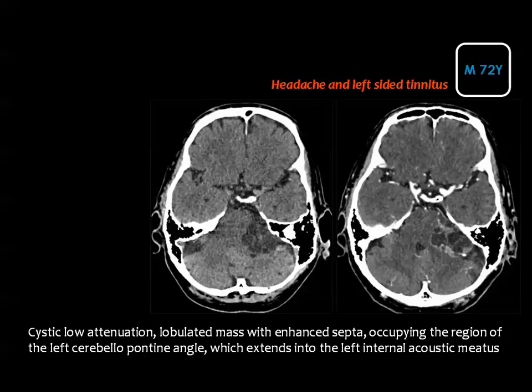Epidermoid cysts do not enhance. No. The most common cerebellopontine angle lesion by far is acoustic neuroma. 94% of the extraaxial lesions at the cerebellopontine angle are acoustic neuromas.